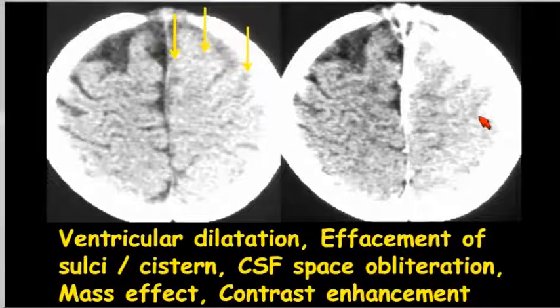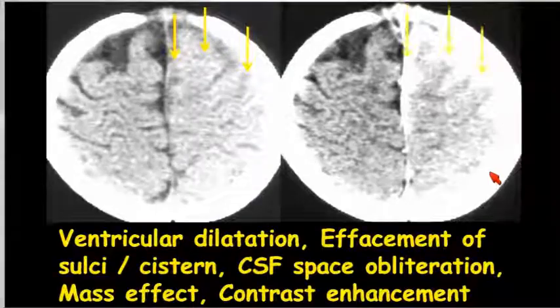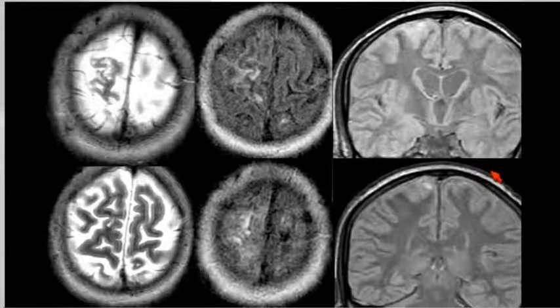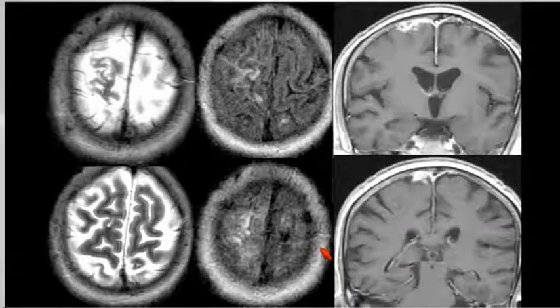They're going to pick up contrast. They're going to be weepy, and so you'll have not only the physical cells changing the density on CT or losing the fluid suppression on T2 FLAIR, and then the more direct enhancement that we've talked about already. In some cases, you'll also see involvement of the ventricles and non-suppression of a T2 FLAIR. That might be an example here.